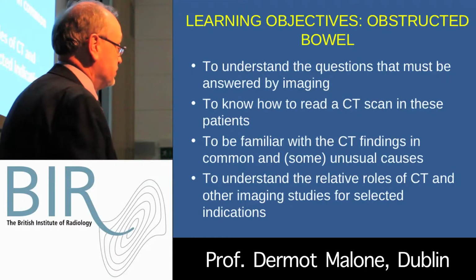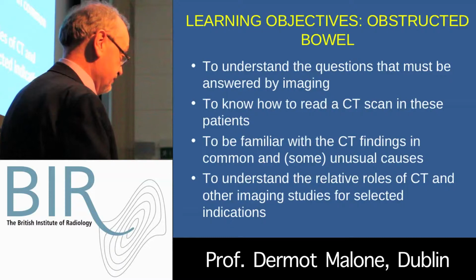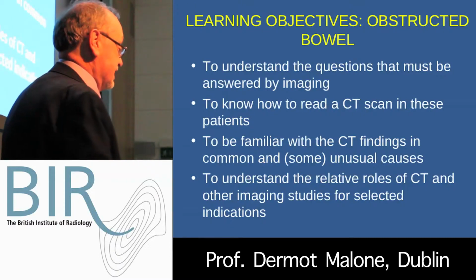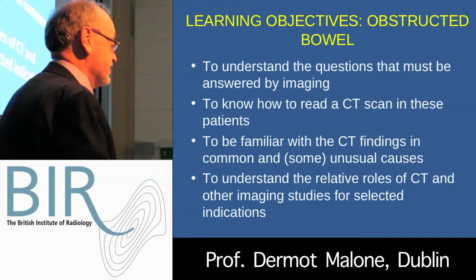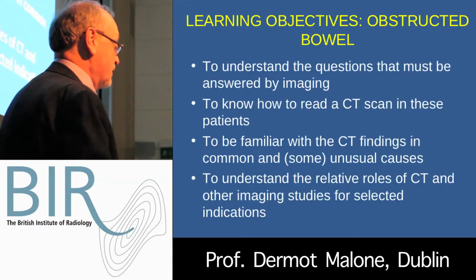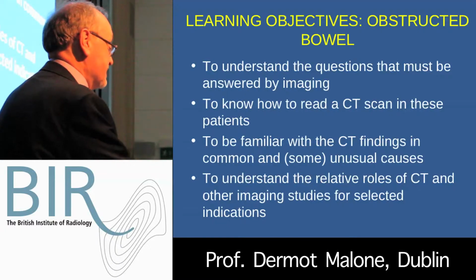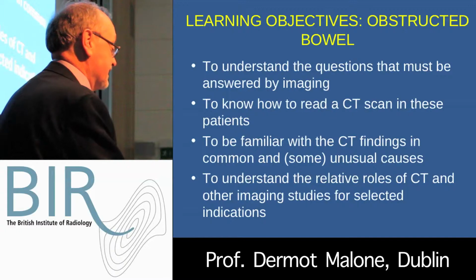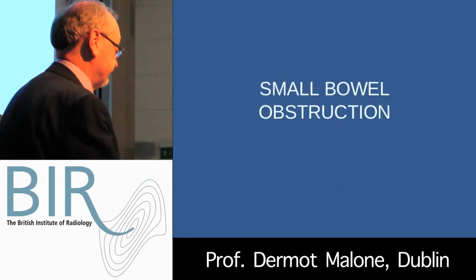I would like you to understand the questions that we are supposed to be answering in obstructed bowel, to know how to read a CT scan of these patients, to be familiar with the CT findings in common and few unusual causes of bowel obstructions. And although CT is the dominant technology in the imaging of bowel obstruction, I will point out a couple of areas where other more traditional imaging studies may be used.